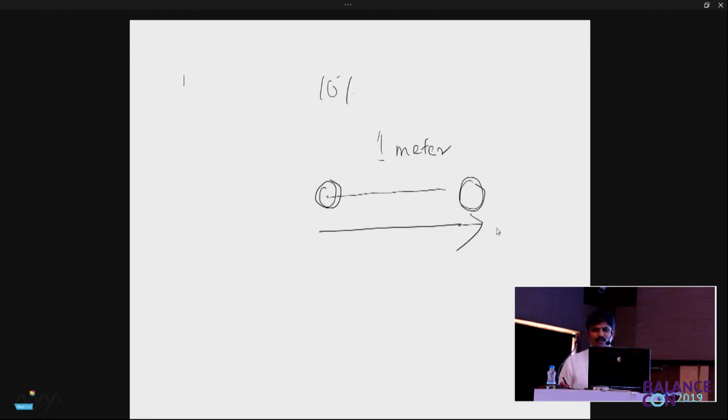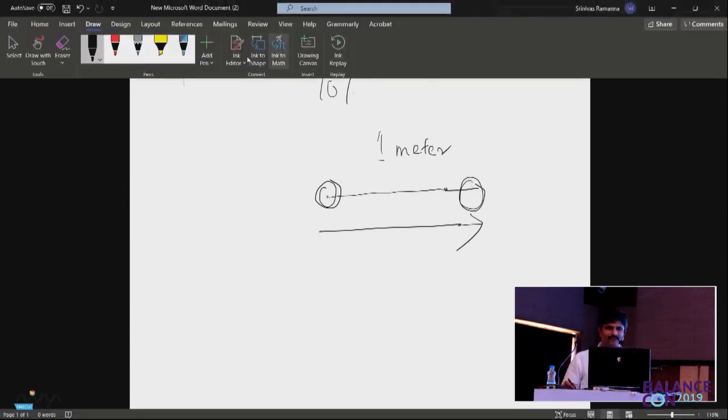He covers only, say, 90 centimeters, and then he stops there for some time. Then he realizes, no, I have still not met the target. Then he goes and fixes. Is that right? How will this appear on a graph?